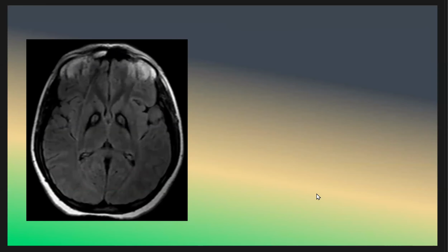What do you think the patient has? We have bilateral symmetrical hyperintense signal changes in the anterior medial globus pallidus with surrounding hypointensity on the T2.